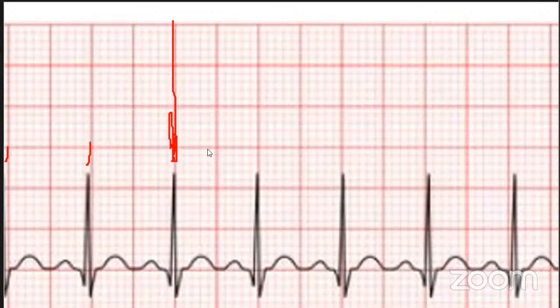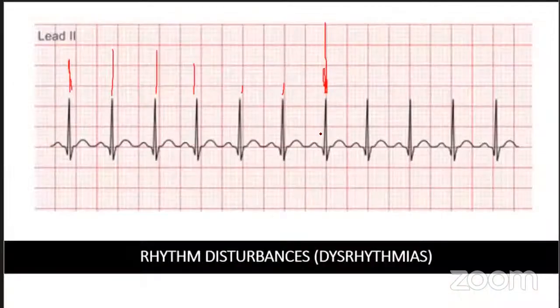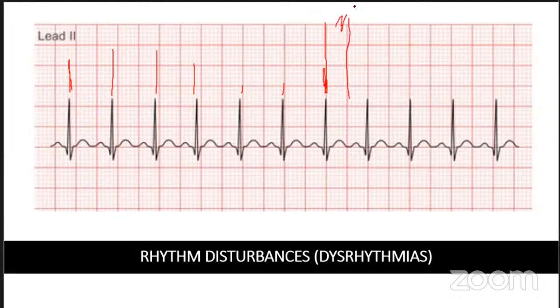Okay. Well done, everyone. So that's a good attempt. Okay, so again, like we mentioned, we said we're going to pick one that falls on a tick line, and then we'll go to the next line, and we're going to label it as what, 300. And the next one we're going to label as what, 150. And you can see that this one fell very nicely on the 150 mark. So again, we're going to call this rhythm a tachycardic rhythm.